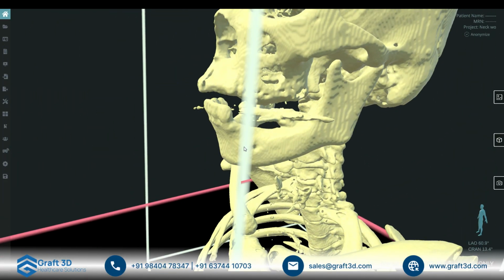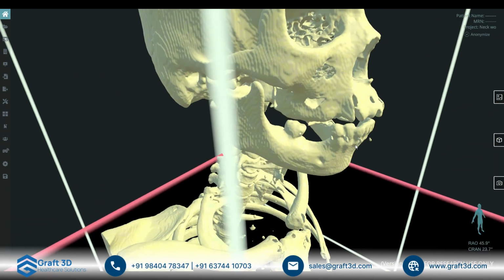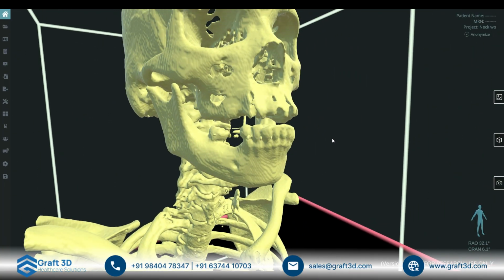Now, to make these structures a different color, you'll go through the select split operation that we went through in our training there. So if I want a different colored mandible, the bone structure is my active structure. Select the mandible in entirety and press split.